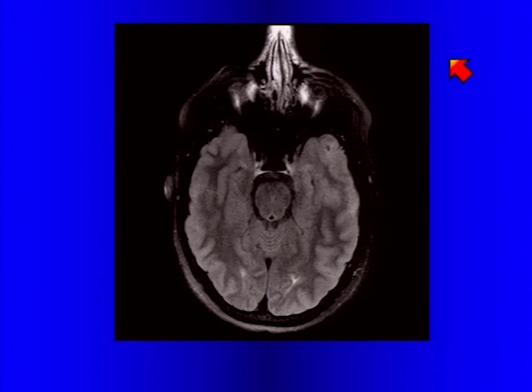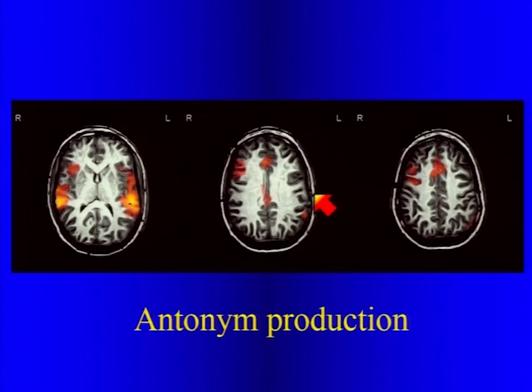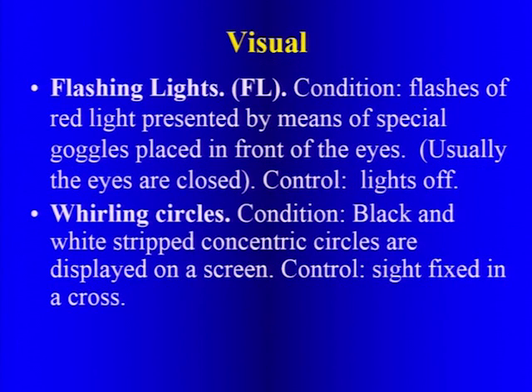To show you another more recent one that we just saw, this is a subtle area of cortical dysplasia in the mesial left temporal lobe. This child had absence seizures, and when we did the language mapping, you can see here that the receptive language is on the left, and in this case, Broca's was switched to the right. So this is important prognostication. We do work closely with our neurosurgeons and the epileptologists on these types of patients.